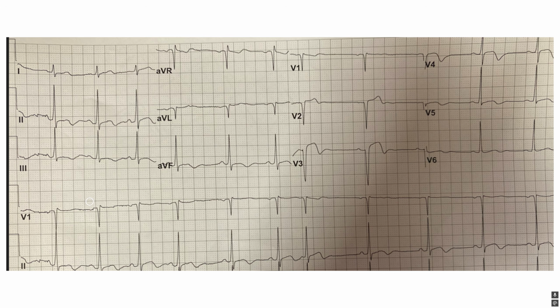And again, while we're doing a rhythm check, you notice these P waves are kind of enlarged and notched here in lead 3, and inverted and relatively biphasic, which is a sign of atrial enlargement. But as an ER doctor, who really cares? For intervals, the QRS is not over 3 boxes. The QTc does not look prolonged to me, but again, I would need the machine for that one.